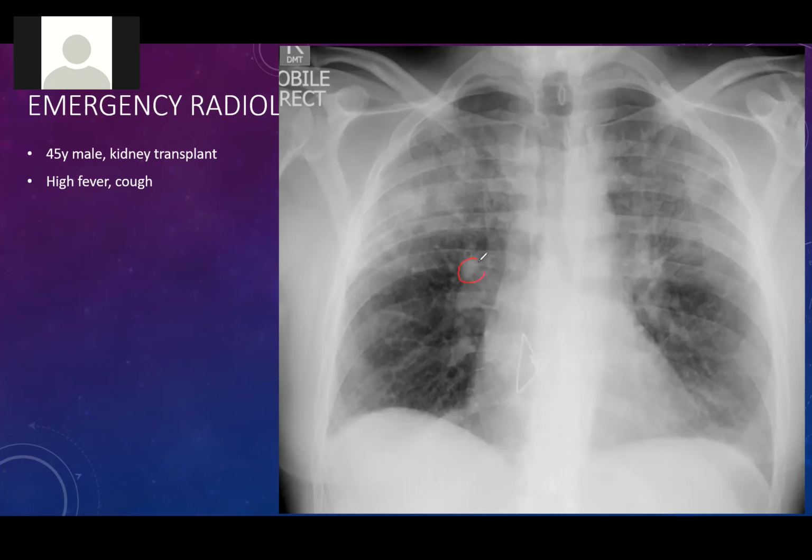This? Yeah. It's possible, but it's most likely a pulmonary artery which is making a right turn and coming at you. When the pulmonary artery is pointed at you, it has a much more prominent density.